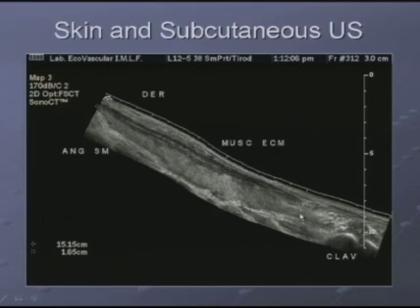This is an intramuscular abscess, but taking all the muscle sternocleidomastoideus. This is a tropical myositis. By using here extended field of view ultrasound, we have the submandibular angle here, and we have the clavicular bone here. We can have here an extended image of 15 centimeters, and we have an altered echogenicity inside the muscle with loss of the normal echo architecture of this structure.